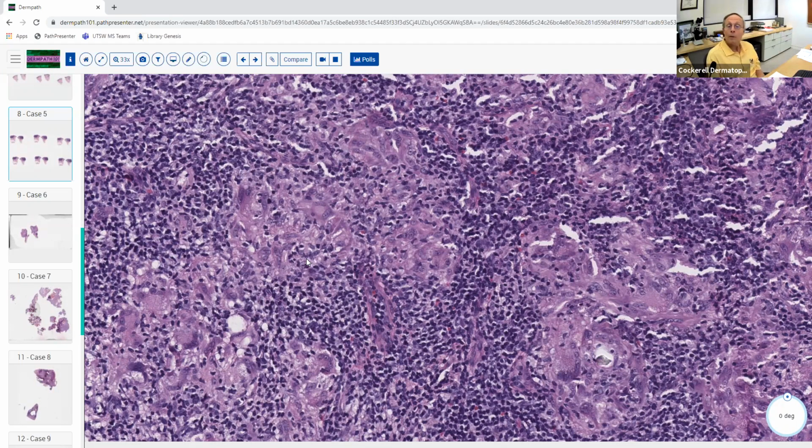You also can talk about sarcoidal granulomatous inflammation or epithelioid granulomas. You see these forming little sarcoidal areas. If you took away all the lymphocytes and just looked at those together, without maybe the multinucleated cells, you might think about the possibility of sarcoidosis, because sarcoidosis has epithelioid granulomas that form round nodular aggregations, usually with few lymphocytes.